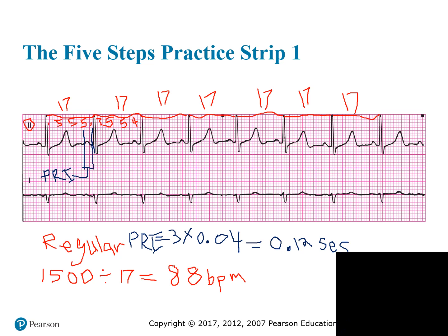So we're going from here, where our PR interval left off at, and we're going all the way, so that's Q, R, S, and just where this point is, right here. Y'all see where this point is? Let's take the pen off. Just where this point is, what we call the J point, is where we're going to draw our line to signify the end of our PQRST wave.